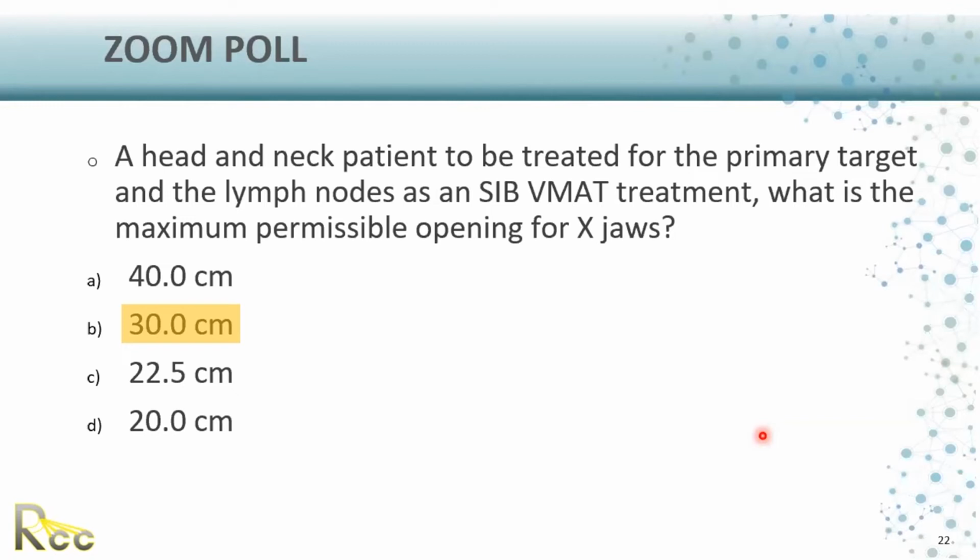The problem is that you have to be sure about the HU values of the inner and outer parts of your table. This makes a big difference, especially for critical organs or small volumes. Let's say you have a small PTV, and you are including your table with the PTV, with the body itself.